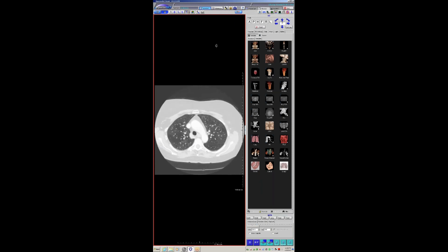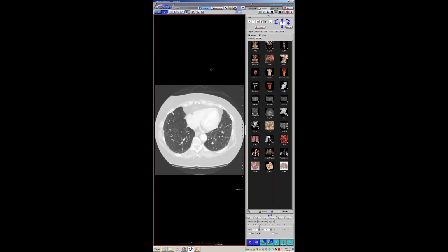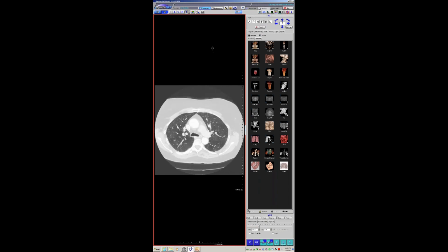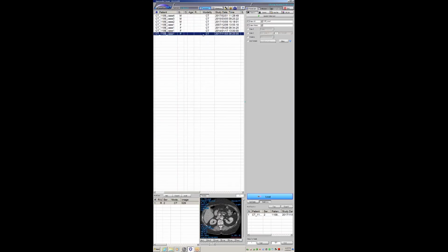I've done that with sarcoid and metastatic breast cancer. Confuse those two. Yeah, I mean, it was just one of these things, you're tearing through cases, it's a long day, and you're like, oh yeah, mosaic attenuation, small airways disease, and then multiple pulmonary nodules, metastatic disease unchanged. And then you just got to take more time than that and really kind of absorb the case. And when I finally did that, came the right diagnosis. But again, we've been imaging this woman for years and been calling it stable metastasis, unfortunately. But the clinicians know because they have path.